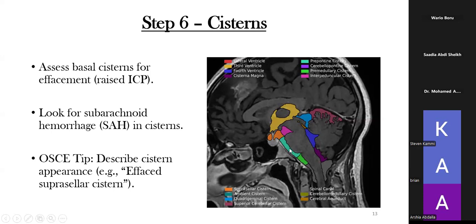Then here we have the ambient cistern. You can see it there. Then here we have the superior cerebellar cistern that is over there. Then this blue here, this one should be the fourth ventricle that is right there. Then here, this light kind of blue, okay, this one is the prepontine cistern. You can see this sort of lime green.